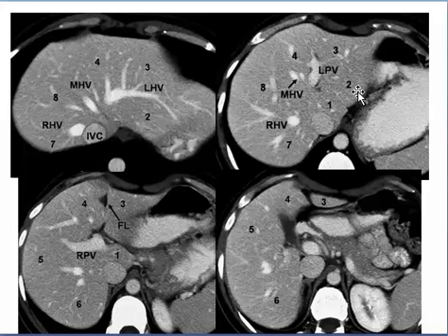So here we have the hepatic vein levels. So this is 2, 3, 4, and there should be another 4 here, 4A and 4B, then 7 and 8. Same, 1, 2, 3, 4, 7 and 8. This is number 1, or the caudate lobe. 3, 4, 4, 5, 6, and this is number 1, as we said.